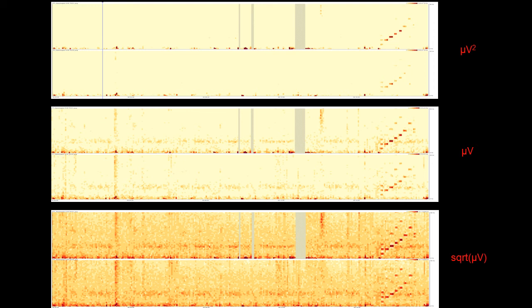For most clinical work, I prefer the bottom square root scaling because it imparts more dynamic range to the depiction of EEG activity, and it jibes better with my visual impression of the raw EEG. All of these parameters can be adjusted after the fact, as desired. However, by using the square root scale, I find that I only rarely need to make adjustments to the z-axis scaling.